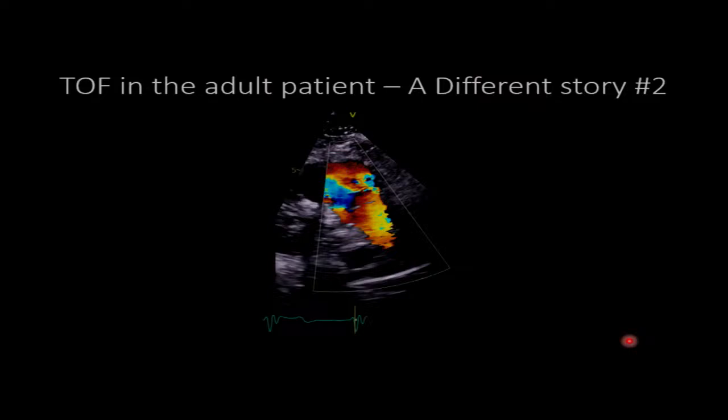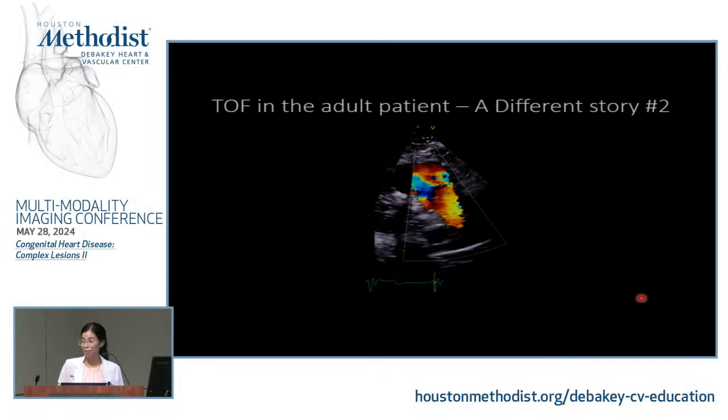So pay attention to pulmonary regurgitation. You need to go frame by frame. It's very different from AR. Many times I see patients where it's very quiet on exam because it's a very short murmur. So in all patients with tetralogy of Fallot, be very, very critical about that. I see many patients that come to me and the echo says mild PR, and it's truly very severe PR. You may be deceived because just like the murmur is short, the regurgitation time is short.